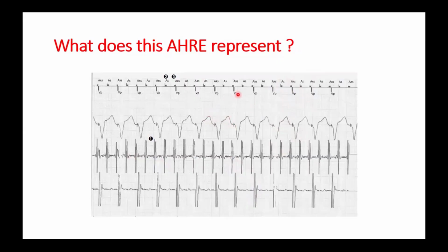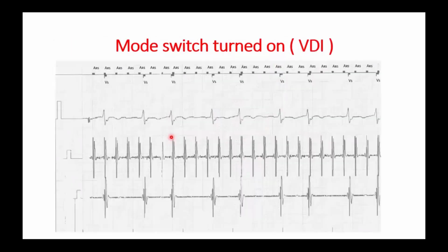In this case, the mode switch was intentionally turned off to record this tracing, actually this tracing from the AV block, and then the mode switch is turned on.